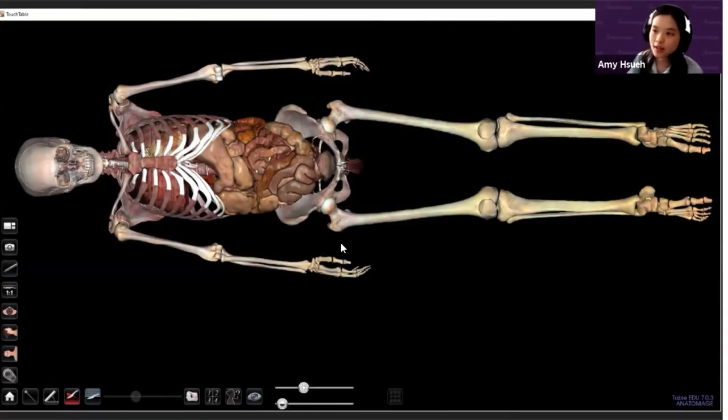The last thing I wanted to point out for everybody using the table is that in the case library, we also have case library linking. If you go into this layouts menu over here, in the middle we have this histology slide.